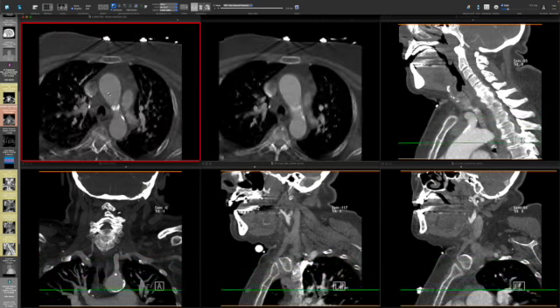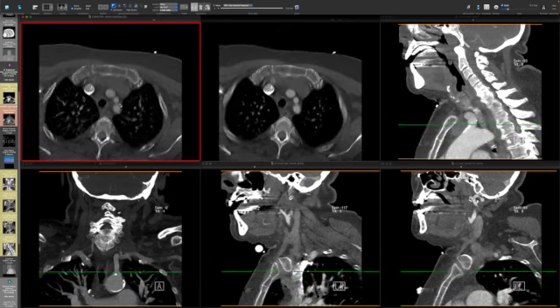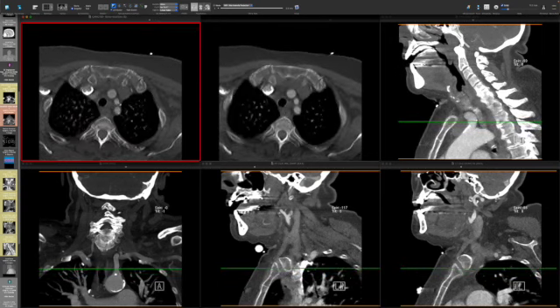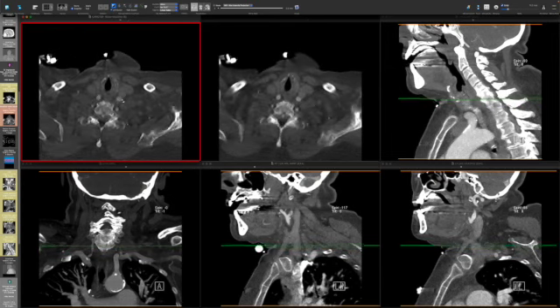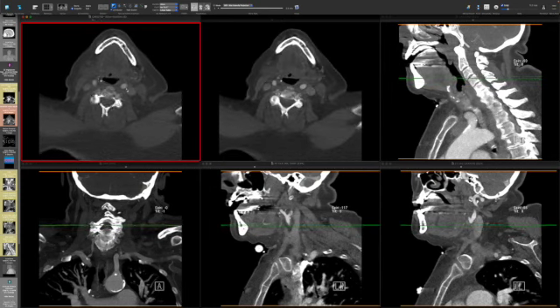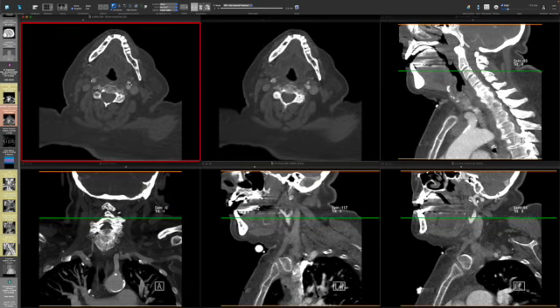So now we're going to run the carotid. Normally I'd start with the right carotid, but that one's going to be abnormal in this case. So we'll start with the left carotid. And I basically go from the origin and we can follow it up. My arrow here is on the left common carotid artery. We're going superiorly. We've got a little bit of tortuosity. It takes some twists and some turns. And at some point here, quickly, we're going to run into the left carotid bifurcation right here. There's a little bit of atherosclerotic calcification at the left carotid bifurcation. And basically, it's going to divide into the left external carotid artery and the left internal carotid artery.